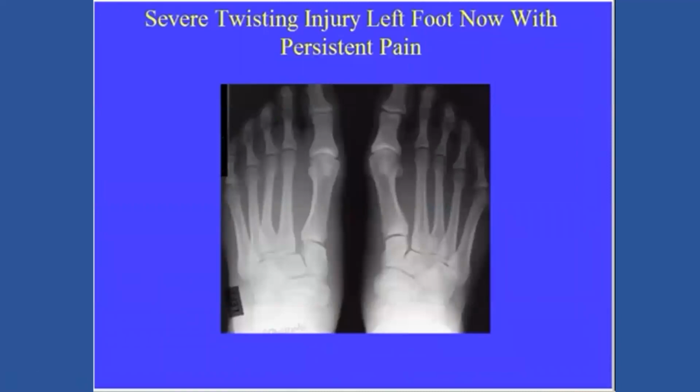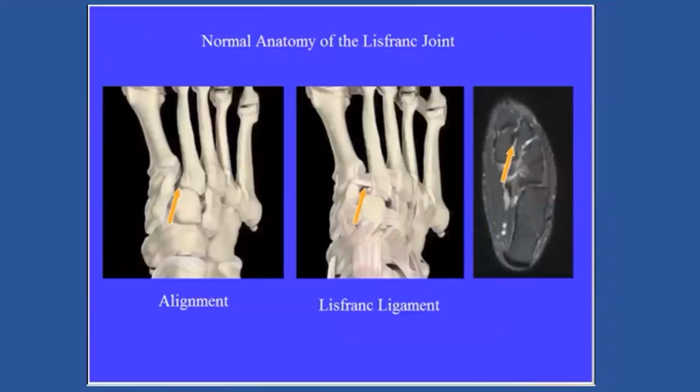And last but not least, you have to think of Lisfranc's injury. We're seeing it more often in sports on plantarflexion injuries, where the whole metatarsus can be displaced either laterally, or the first metatarsal medially, or it can be both ways. At times you have a fragment of bone, which is called the fleck fragment. This is an avulsion of the Lisfranc fragment between the cuneiform and the second metatarsal. So this is all, and thank you very much.